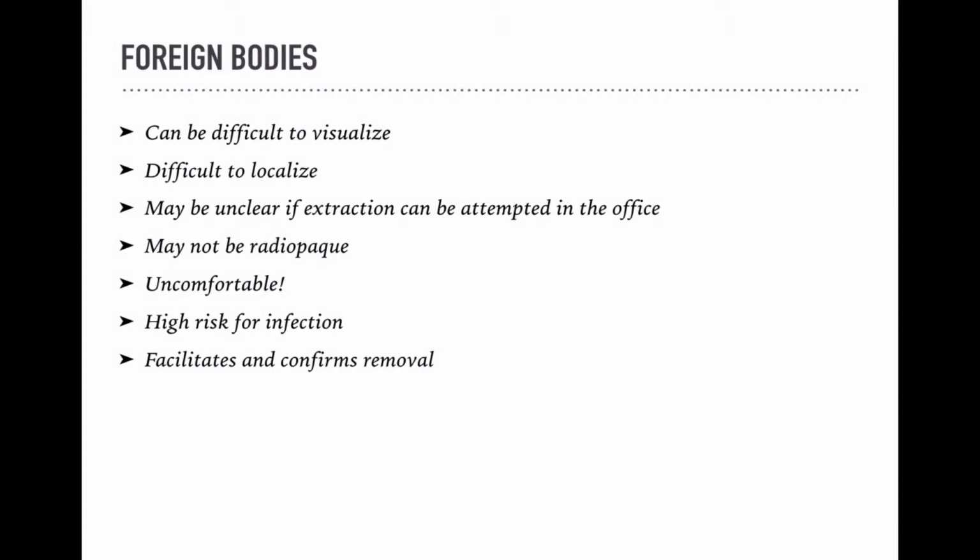Let's talk about foreign bodies real quick. They can be very difficult to visualize, especially if they're not radiopaque on X-ray. They can be difficult to localize, and you may end up inadvertently digging in a patient's foot or hand, causing local tissue trauma. It may be unclear if the extraction can even be attempted in the office or in the emergency department, and it's uncomfortable for the patient, so you want to do this well. There's high risk for infection, and most importantly, ultrasound facilitates and confirms the removal of those foreign bodies.